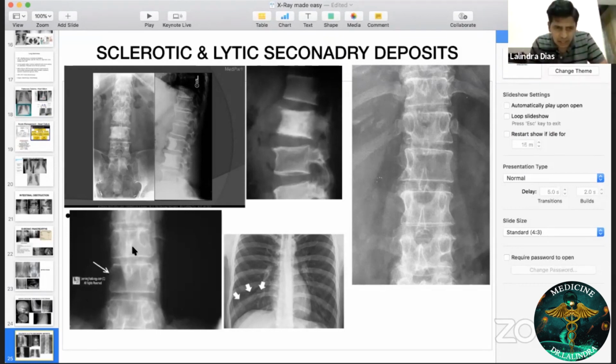So you see this one. Now in a normal X-ray, you have what is called owl's eye appearance. Now look at this vertebral spine. In this vertebral spine, can you see two eyes? Here, it's one eye, this is the other eye, this is the nose. Two eyes, nose. Can I say two eyes here? No, only one eye. What has happened to this side? That eye is gone.